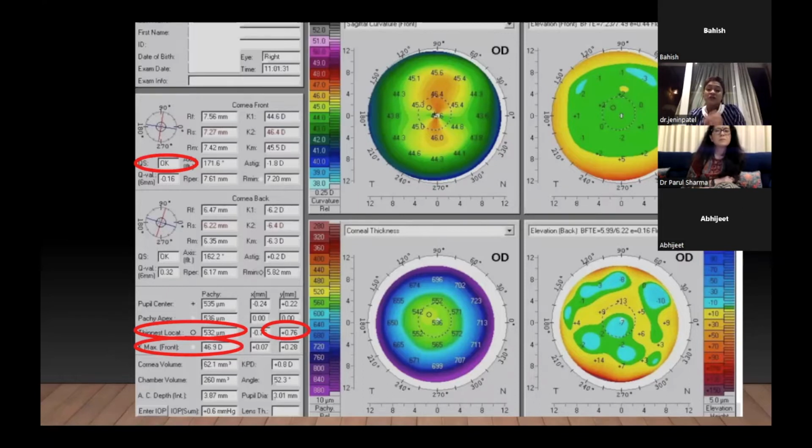So this particular map tells us that a cutoff of 0.5 is acceptable, but anything between 0.5 and 1 should raise suspicion, and anything more than 1 should definitely be considered abnormal. So here, if you have a plus 0.76, you're raising your eyebrows, but you're seeing a plus that's displaced upwards. Okay, now the next thing you want to look at is the Q value.